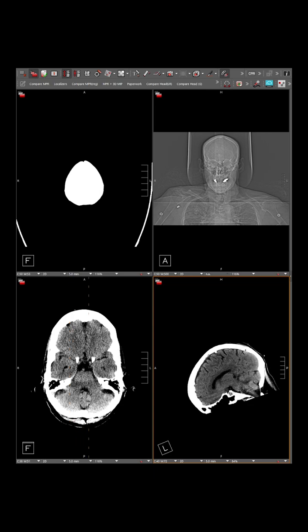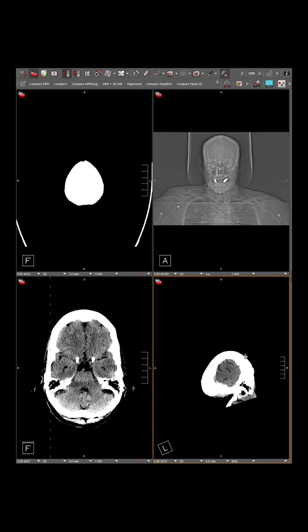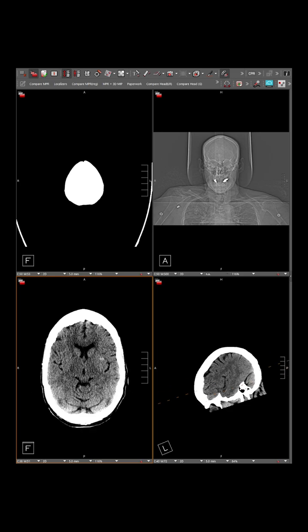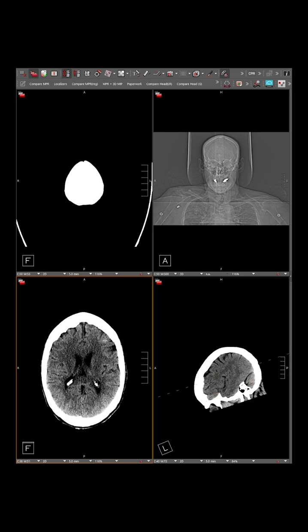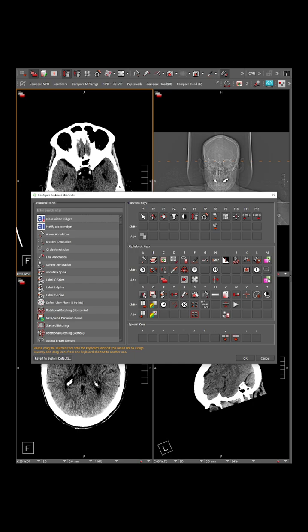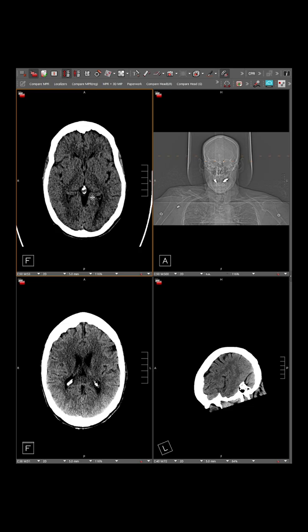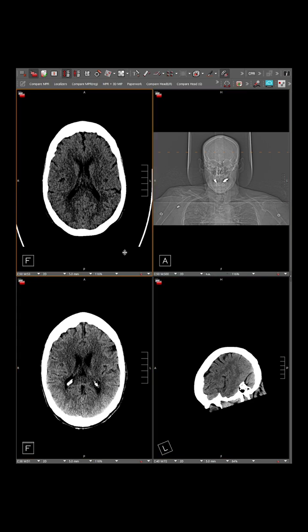There are ways to create different auto scroll tools with different functionality, but that requires another approach than the inbuilt hotkeys. Another thing that's useful, particularly for people doing academics or working on projects, is setting screenshot to hotkey. There are different types of screenshots. You can do the active viewer, you could do all viewers. So I have these Alt S for screenshot. If I press S, that brings this to the clipboard, so now I can paste this into a PowerPoint, right? And if I press Shift S, I think it captures everything, or Alt S captures.